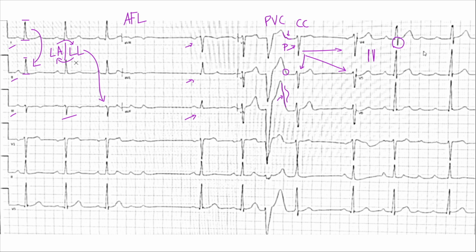But I want to show you. So this was taken when the patient arrived in the ER, right? The patient was symptomatic. And I'm going to show you now what the ECG looks like a couple hours later, but pay attention to this, please. Look at the size of this S wave. This is humongous. All right, now this is a PVC, right?